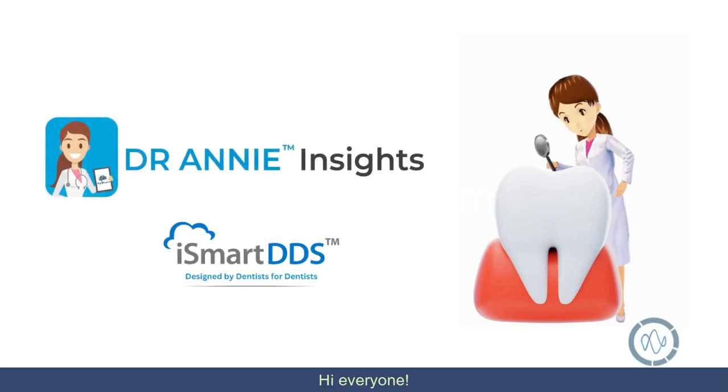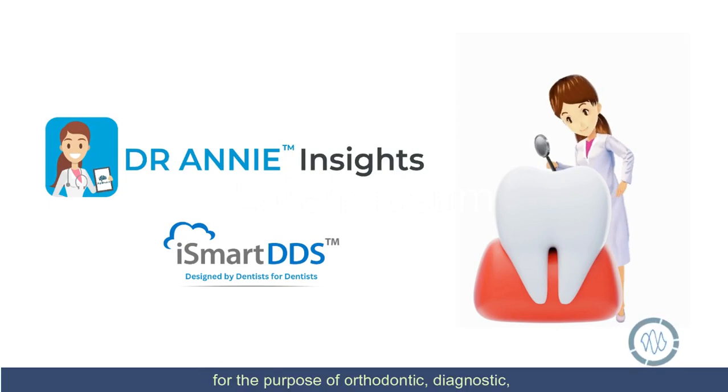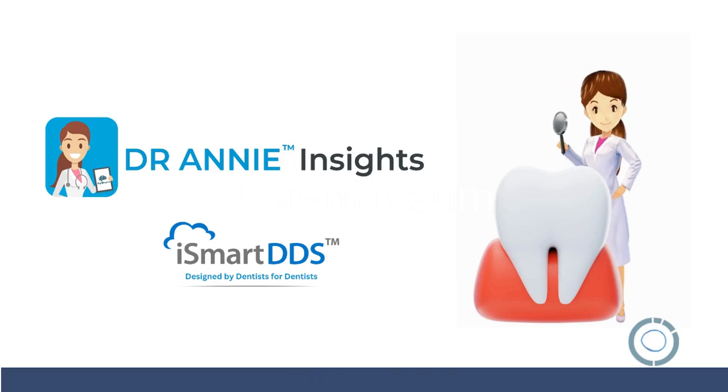Hi everyone. I want to show how to use and utilize Dr. Annie Insights for the purpose of orthodontic diagnostic and treatment planning.